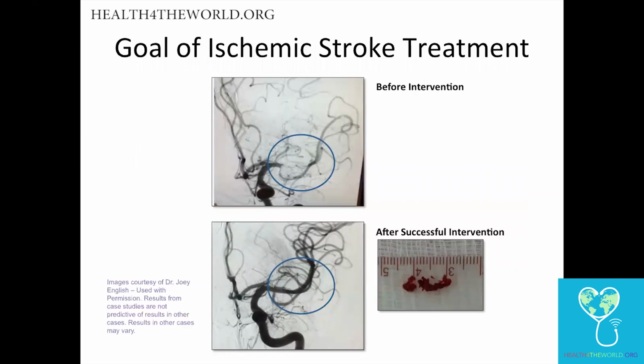The idea is that on this top image here, you can see we have a patient who has an occluded middle cerebral artery. And then this is a post-recanalization action here. This is one of our colleagues, Joey English. And so this is some of the clot that came out of that.